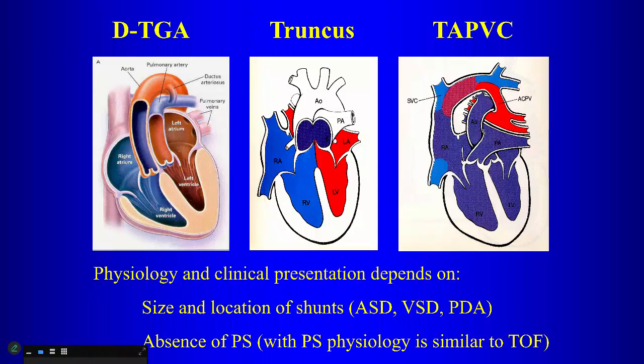Ventricular arterial discordance. That's all it means. It means a morphologic right ventricle is connected to the aorta, and a morphologic left ventricle is connected to the pulmonary artery. There are two flavors of transposition. There is D-transposition, which is what we are talking about here in this category, but there is also L-transposition, or congenitally corrected transposition, that we will get to later.